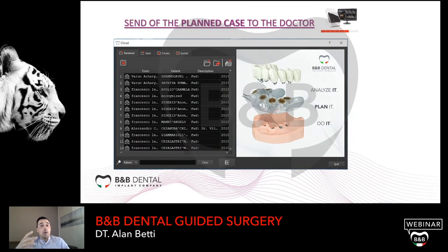This is our cloud. After the planning, if the plan is done at B&B Dental, of course, we have the possibility to share the project with the doctor by mail.